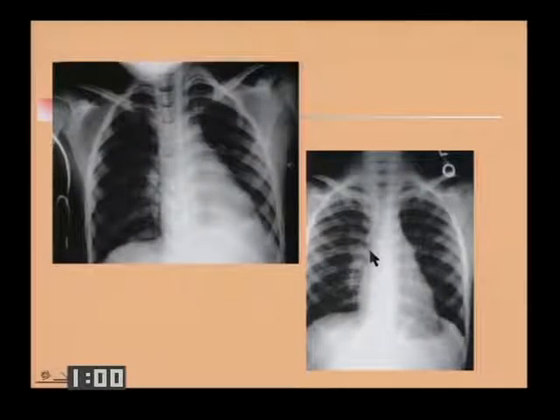And if you have a child that was a preemie at birth, it becomes very difficult, unless the mother walks in with his old film, or unless you have access to the old films, to know sometimes what's acute and what's old. Asthma can develop, or atelectasis can develop and clear very quickly. So if you have a child that goes from this to this or from this to this quickly, meaning within 24 hours, you're thinking about atelectasis rather than a pneumonia. You think about asthma. Other hallmarks of asthma and viral illness would be hyperinflation of the lungs and peribronchial cuffing.